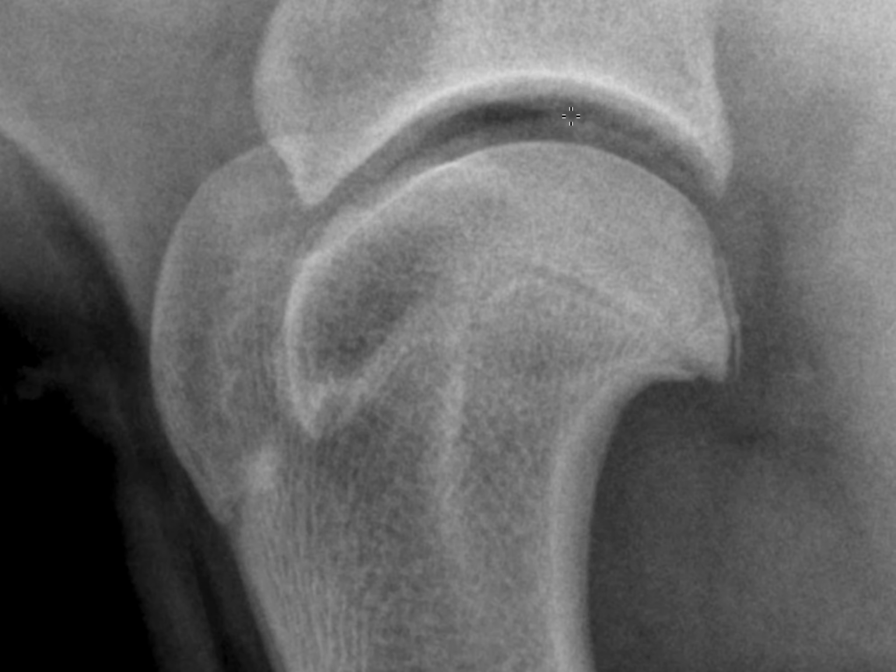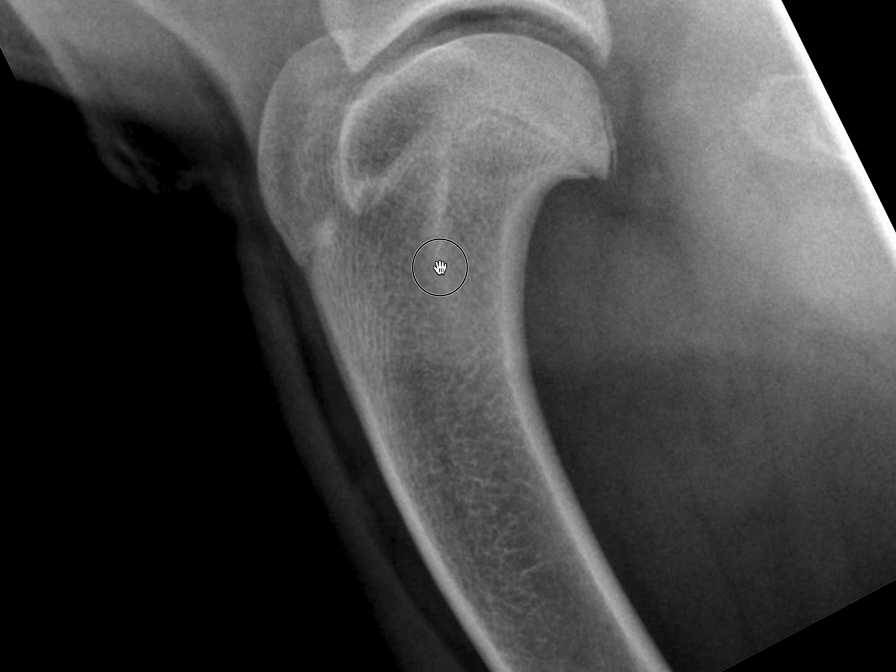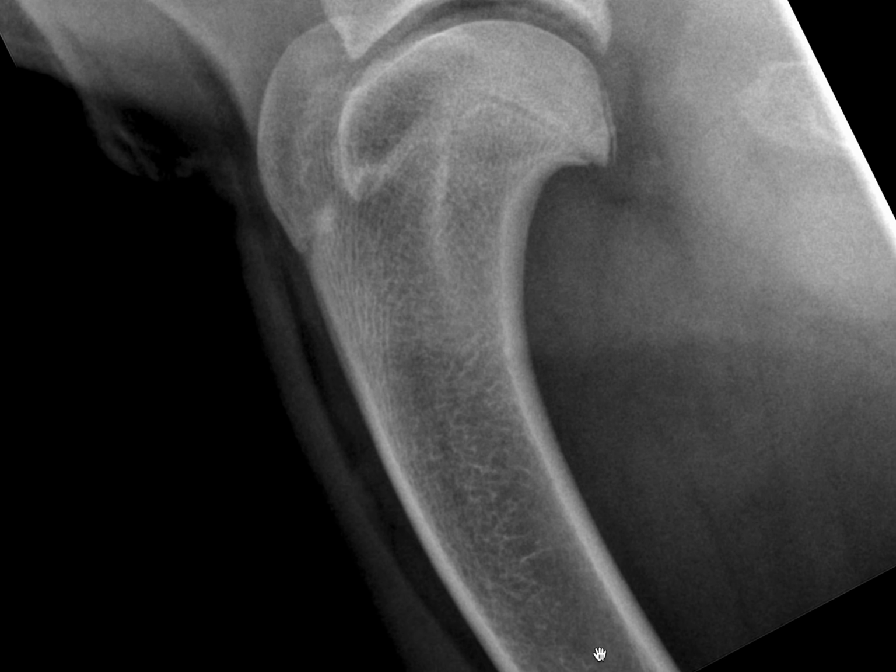Now, just make sure that you are thorough and look at the rest of the radiographs. In this case, I would pay particular attention to the metaphysis and to the diaphysis. Look that you can see the trabecular bone. And this is just to make sure, as it is a young dog, that you are not missing panosteitis or any other concomitant diseases here. So to conclude, the dog has osteochondritis dissecans with some secondary degenerative joint disease, and this will very well explain the clinical signs of the dog.